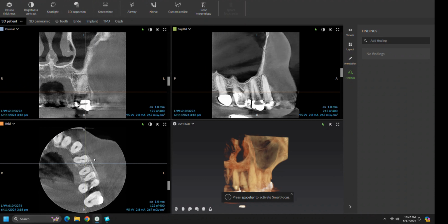So that's about it. I know the patient is heading back to the specialist. This is a great site for an implant, plenty of bone, so a socket preservation here would do us very well. If it's already been planned by the specialist, then we'll let them continue with that. But we have a lot of options here.